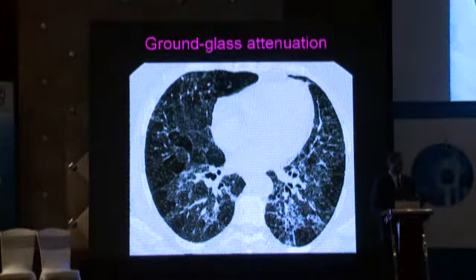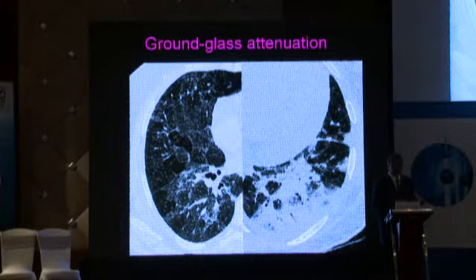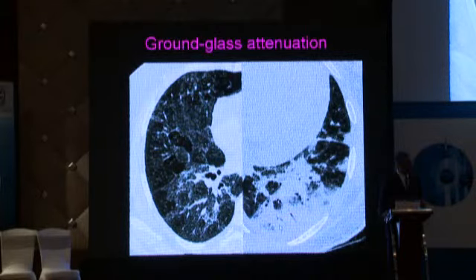So these were all the reticular diseases. You have the UIP, IPF, the NSIP, septal thickening. We then move on to a completely different spectrum of conditions. These are the ones that present with parenchymal or alveolar or mixed interstitial alveolar opacities. We have ground glass attenuation, that is a common sign, which is increased opacity in the lungs that does not obscure the vessels, and we have consolidation, which obscures the vessels and then presents with air bronchograms and bronchiolograms.